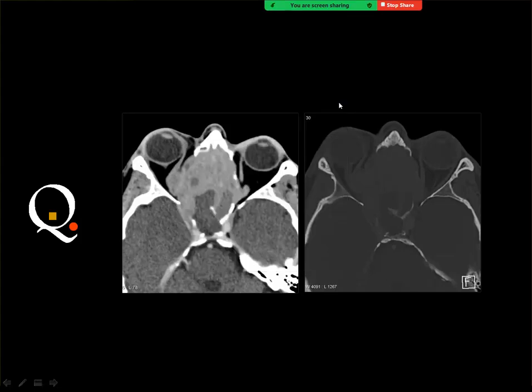Okay, and this is squamous cell carcinoma, or you mean that there is a carcinoma of the ethmoidal air cells, and this tumor has eroded the medial orbital wall on both sides with interorbital extension, maybe extension into the sphenoid sinus. And you know that most of the paranasal sinus tumors are squamous cell type, and few are of other types, but you should mention first that this is a carcinoma.